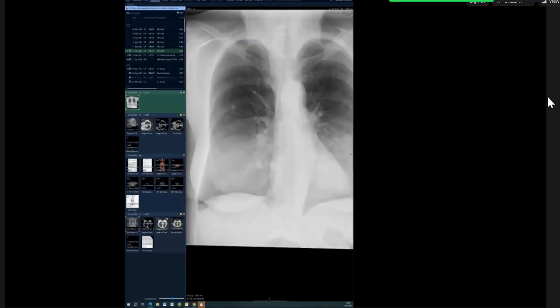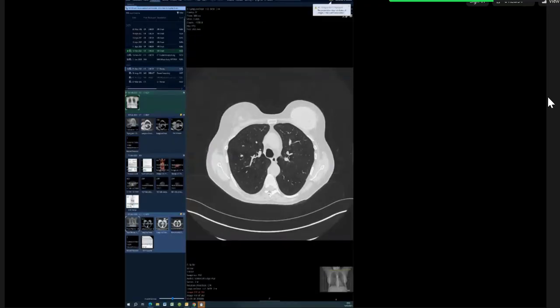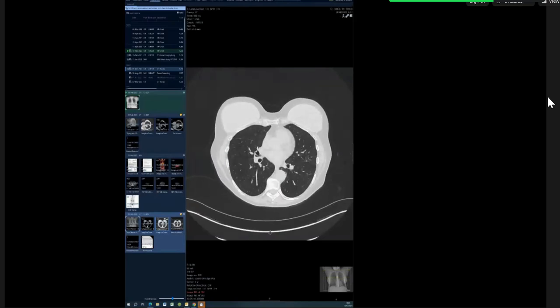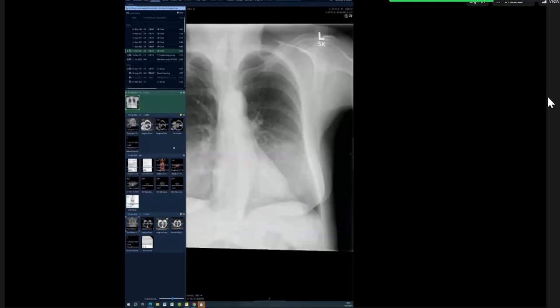This was a nodule. I think this was picked originally as well, but the CT gets confusing because the nodule's on the right. So that's the nodule you're looking at. And this, you didn't even see on this X-ray. Even if you go back, I still can't see it. So the bigger cancer was actually hidden.